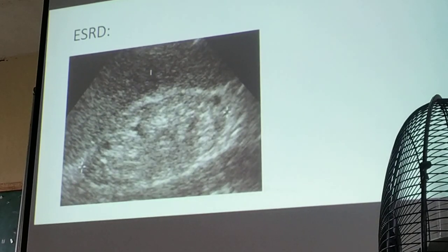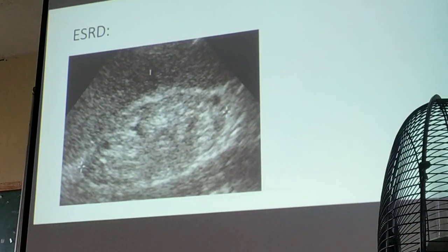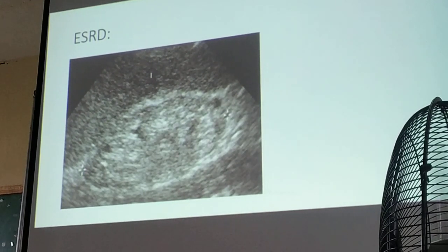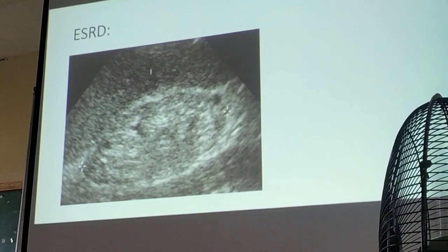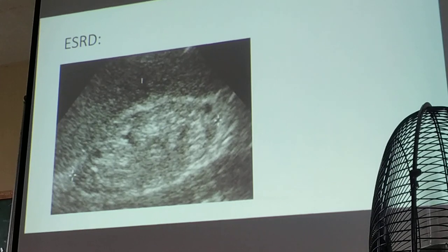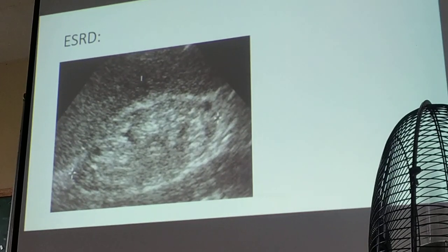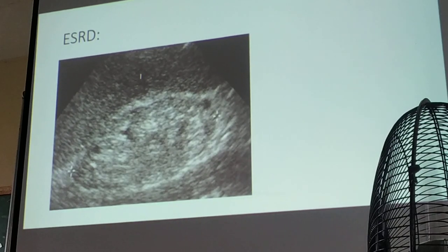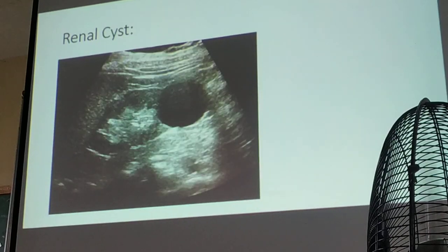Right, I made mention a while ago that the cysts are usually seen on the cortex. But in polycystic kidney, you would also see some cystic structures on your medulla. At this picture, you could no longer distinguish the corticomedullary junction. Right? Here.